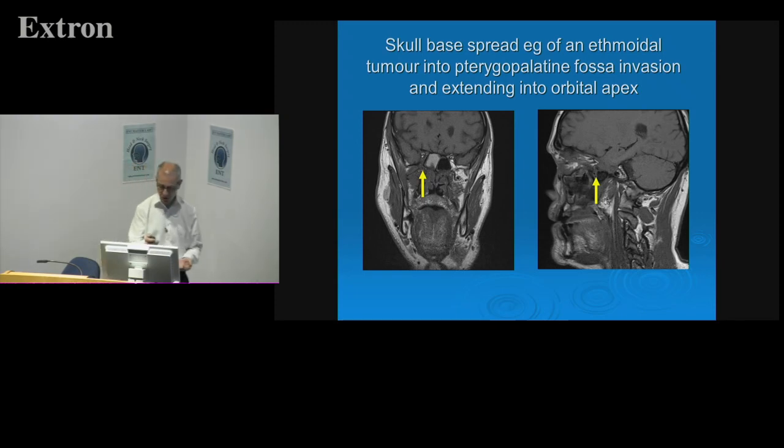And this is just showing you that complex shape of the pterygopalatine fossa. You can see it curves round in that sort of crescentic way, as well as the mediolateral diameter that I showed you on the axial images.